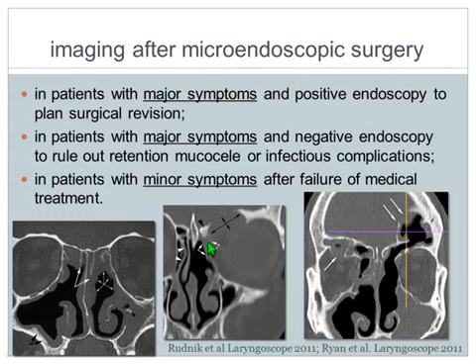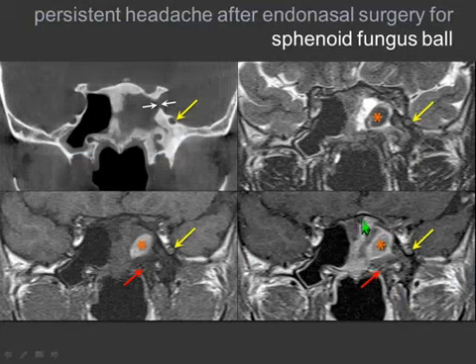In this other situation, there was a synechia between the residual middle turbinate and the medial wall of the orbit. Therefore, the drainage from the frontal sinus was not possible, and you have a mucocele. Mucocele will erode the walls. Therefore, you can have a complication either in the direction of the intracranial content or in the direction of the orbital content. And like a situation like this, in which on both sides you have, or you had before, mucocele with progressive resorption of the sinusal wall, and this can be demonstrated by imaging.